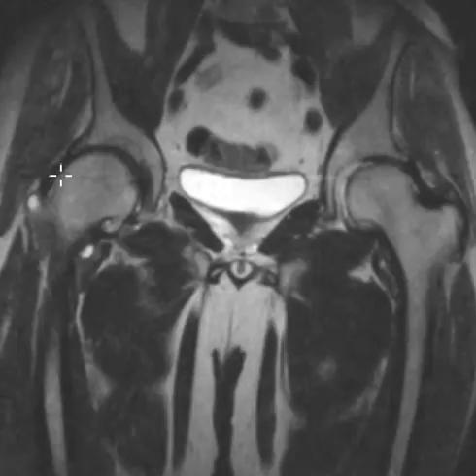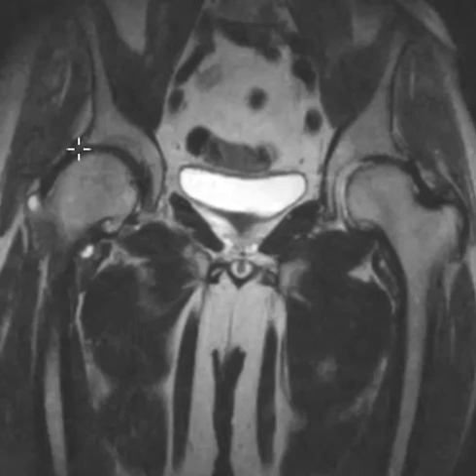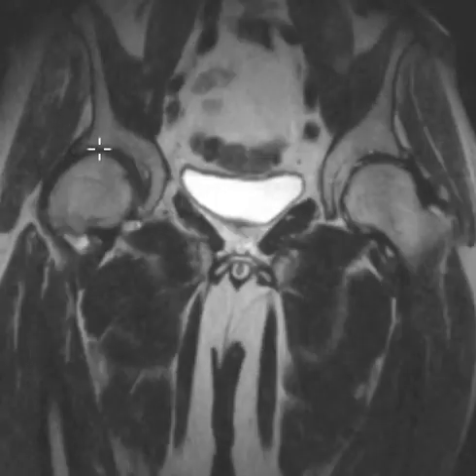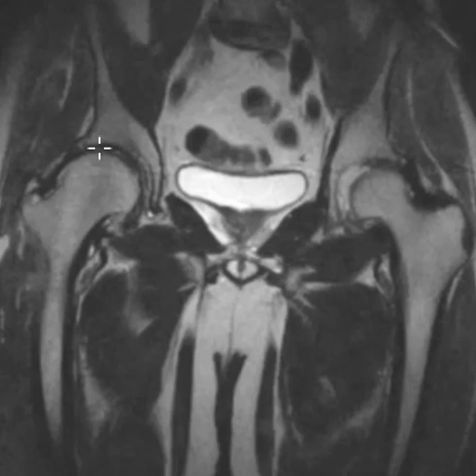You can see how when the patient lifts their hip outwards, it's going to pinch into here, or if they lift their hip forward, it's going to pinch into here, and that can cause tears or injuries of the labrum, which is a little piece of tissue right along the rim of the cup here. Sometimes it will cause bone erosions here, or sometimes just restricted movement. They try to lift up and it starts to pinch and they stop, but here's that broad protuberance. So this is called a CAM type femoroacetabular impingement.